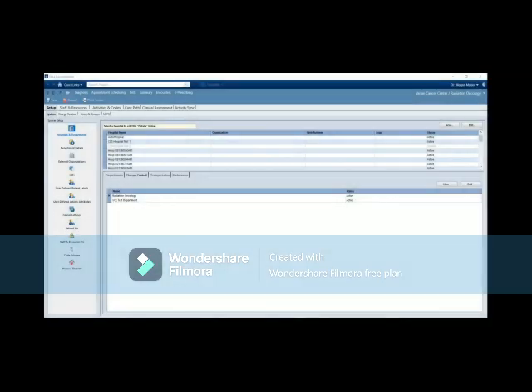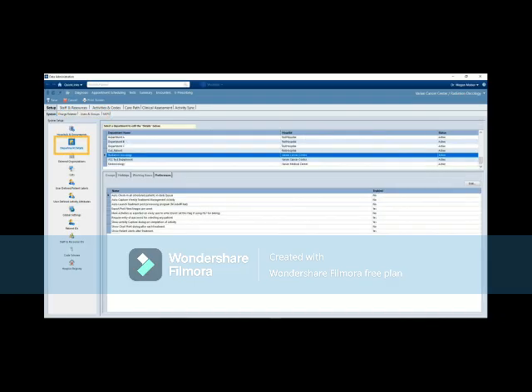To set departmental preferences in Data Administration, select Setup. Select System. Click Department Details icon. Select Department. Select Preferences. Click Edit.